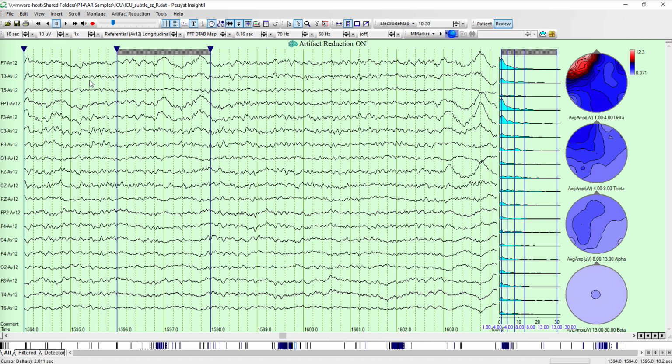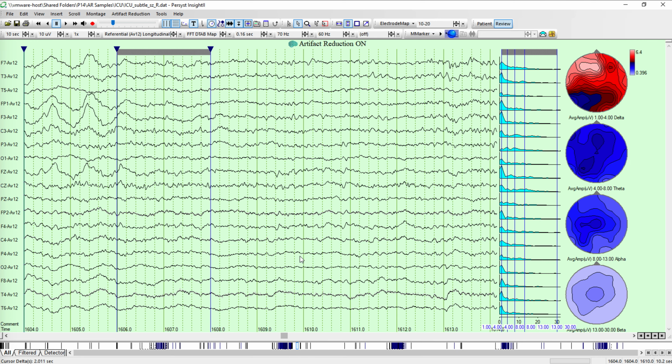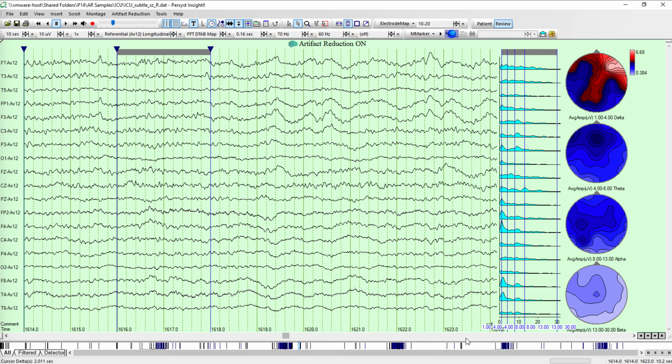And that's that. Then you see these other components contributing to the delta map. That's the important thing: you look at the EEG and you can make sense of what you're measuring and what you're seeing in the map. Because maps without the EEG are sort of like closing your eyes and walking on a mountain with a topographic map. It's good to have your eyes open and see the details so you know where you're setting your foot.